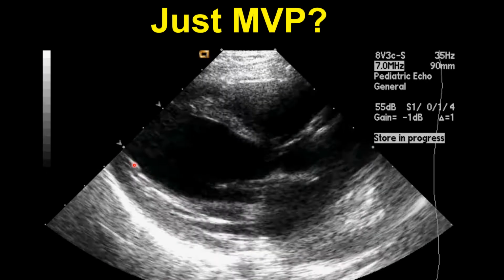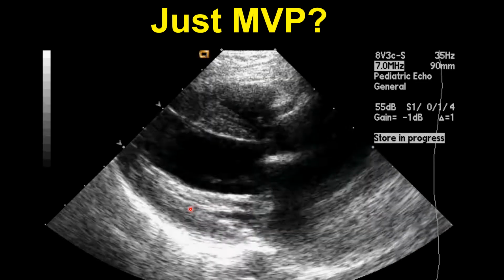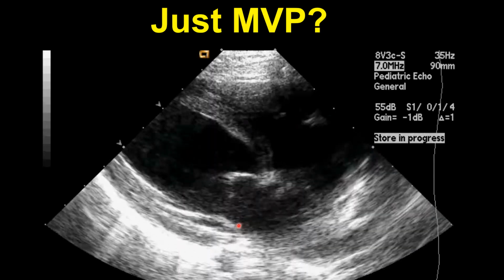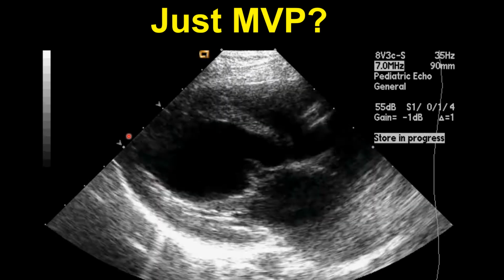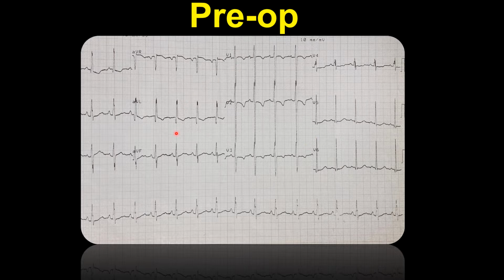Here we can see that there's some damage to the endocardium. We see some thickening of the chordae tendineae, and we also see the left ventricle is quite enlarged. So pre-op EKG, there is an almost diagnostic Q wave here, not in lead 1, but in lead AVL. We also see LVH with strain pattern, inverted T waves, very tall complexes, and this is really some impressive cardiomegaly.